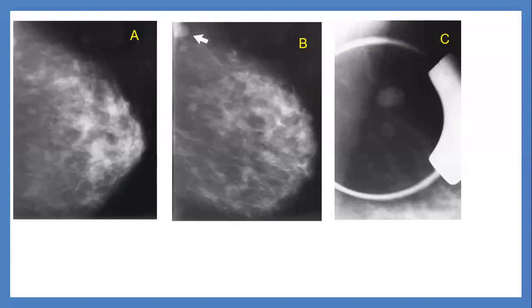It could be there could be a lesion with the breast, and, for example, I am suspecting malignancy with metastasis to lymph nodes. So, lymph node where? You look at the spot magnification, it is near to the pectoralis, but it is not within the axilla. So it is close to the axilla, but not in the axilla.